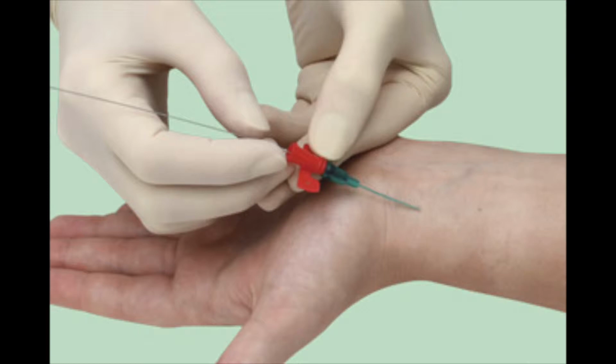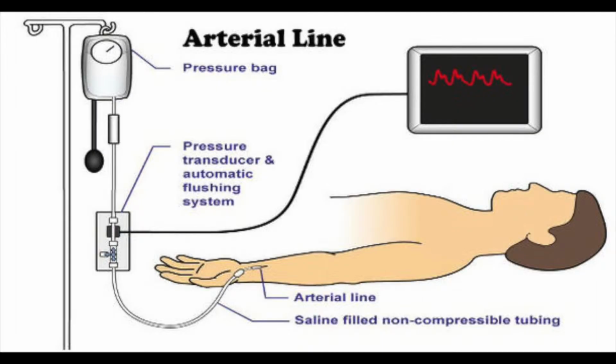The bedside measurement of arterial pressure values from waveform analysis can assist and facilitate the rapid diagnosis of cardiovascular insufficiency and also monitor the response to the treatments aimed at correcting either hypo or hypertension or any other electrolyte imbalances that might be found through the sampling of the blood. Now, following successful arterial catheterization, the connection of the catheter to a pressure transducer should reveal an arterial pressure waveform that can be used to assess a variety of vital sign trends as well as ongoing patency of the line.